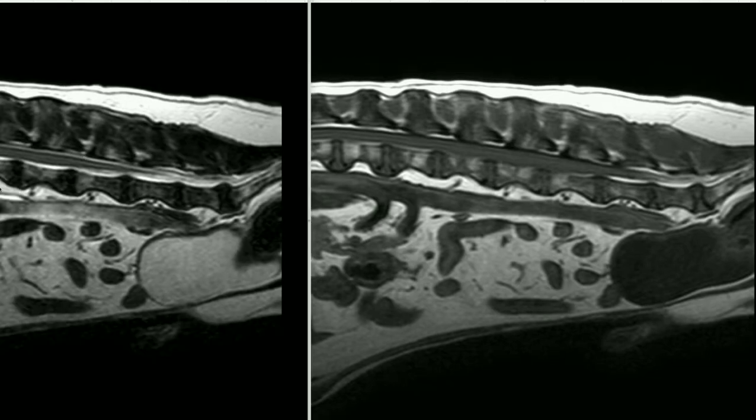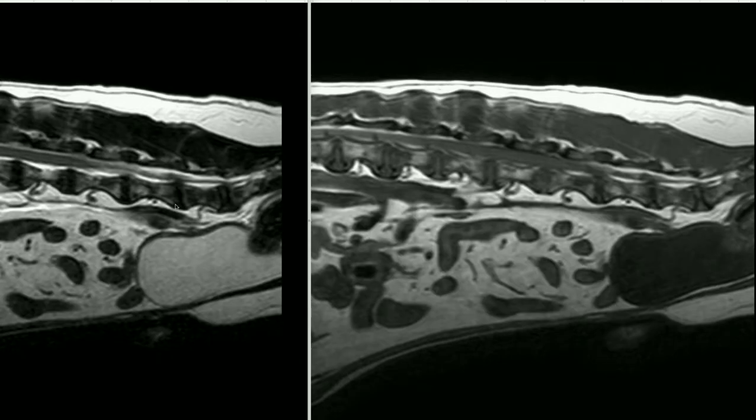So here we have the sagittal T2 and sagittal T1 weighted images. We can see that the T2 weighted images show degeneration of all the intervertebral discs with a reduced signal intensity of the nucleus pulposus, not unexpected in an 11-year-old dog. There appears in the midline sagittal images that we have mild protrusions of multiple intervertebral discs, but the size of the protrusions themselves is quite mild. We don't really see any convincing signs of displacement or compression of the spinal cord or cauda equina.